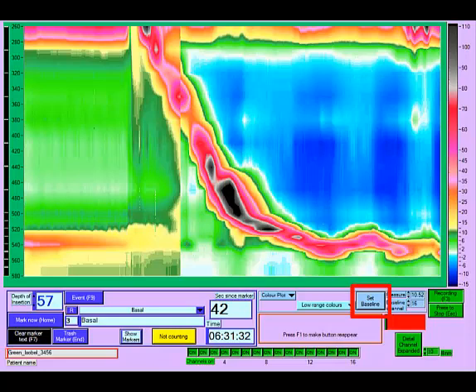Unlike setting the zero reference pressure, setting the baseline does not change the data that is recorded. It only changes the screen representation of the data. You can therefore change the baseline as many times as you like during the study, and in fact will need to reset the baseline whenever the patient changes position.